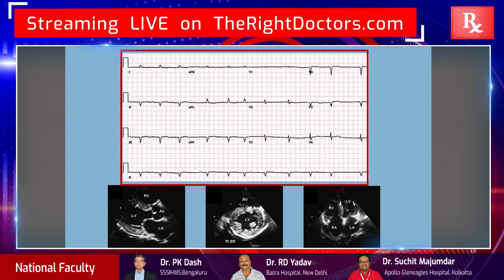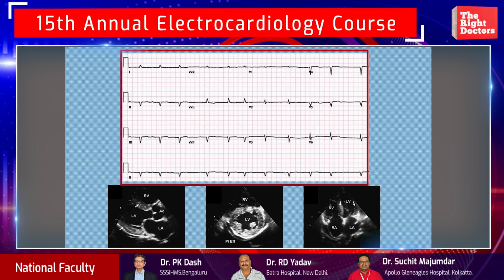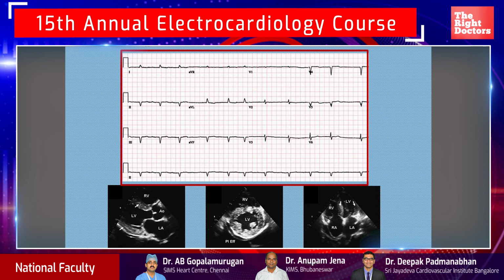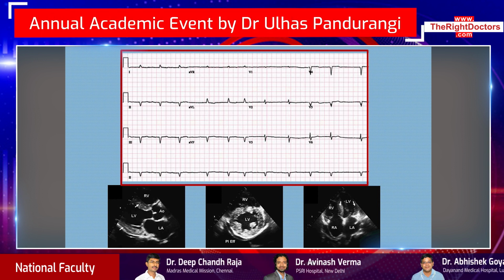This you can see almost a pseudo-infarction pattern. This we call a pseudo-infarction pattern in the limb leads, 2, 3, aVF. Easily anyone would say this looks like an old inferior wall myocardial infarction. But again, you have to consider the low voltage complexes, take into account the history of the patient, examine the patient, and here this patient was in fact a case of cardiac amyloidosis.